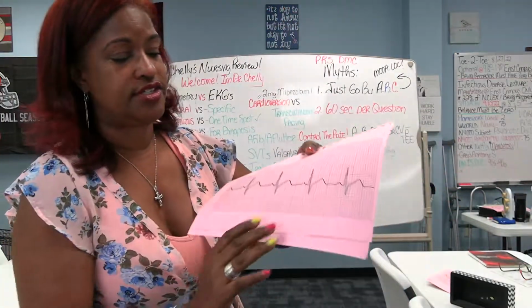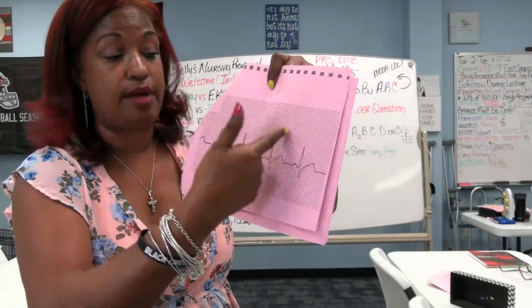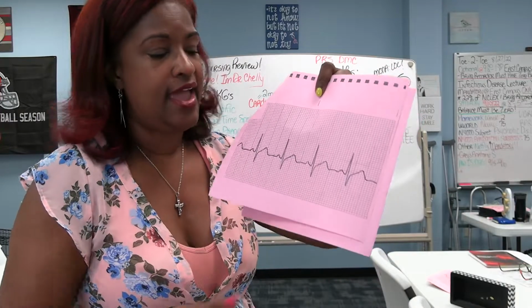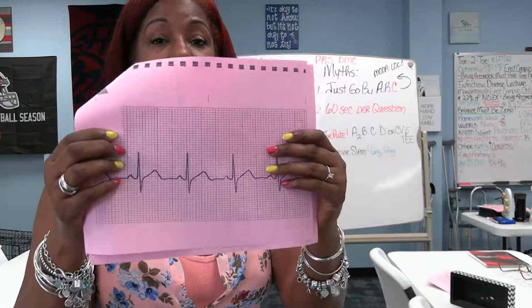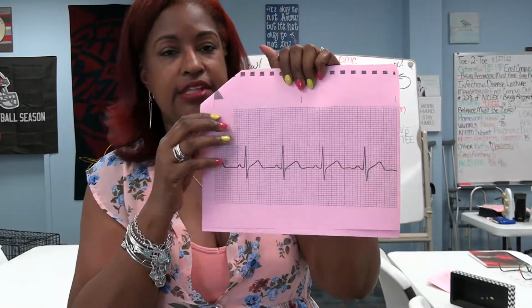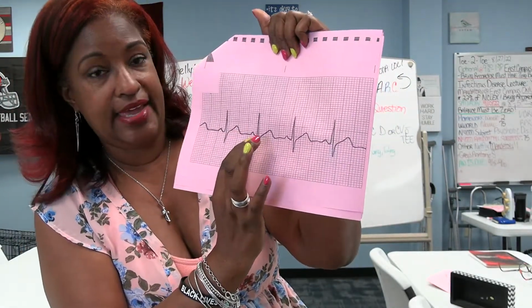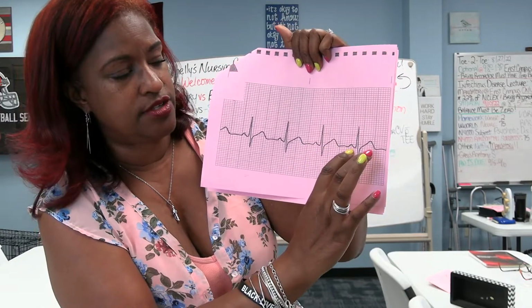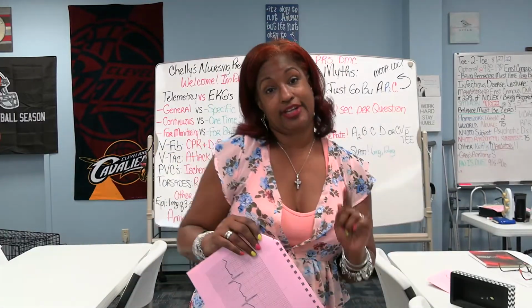You get these spiky little things here, and you see 1, 2, 3, 4 spikes. The tops of the spikes are your R's. The tiny little mountain right behind the R's is a P, there's a P, there's a P, and there's a P. Now, what is it about the P wave? It's small. It's usually more rounded. It's a lot shorter than what comes after the QRS. It's extremely predictable. In fact, we say P for predictable.